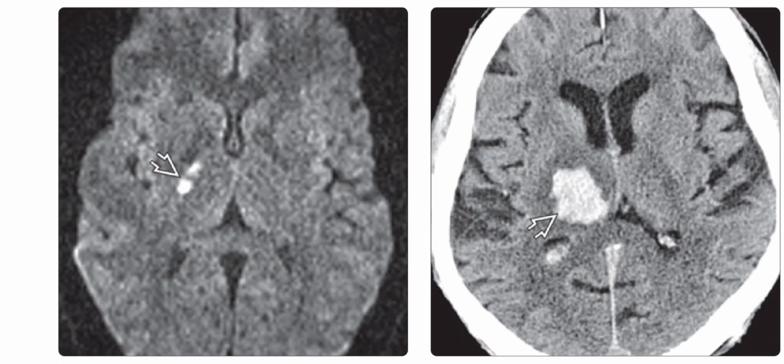The left image is again the axial DWI MRI, and it shows hyperintensity related to the acute ischemia in the posterior limb of the internal capsule in an anterior choroidal artery distribution. The anterior choroidal artery typically supplies the lateral midbrain, uncus, thalamus, posterior limb of internal capsule, and the optic tract. The posterior choroidal artery typically supplies the pulvinar, thalamus, medial temporal lobe, splenium, and choroid plexus.